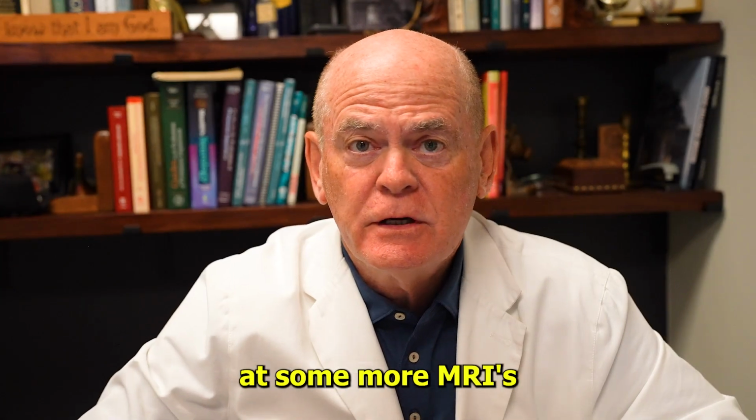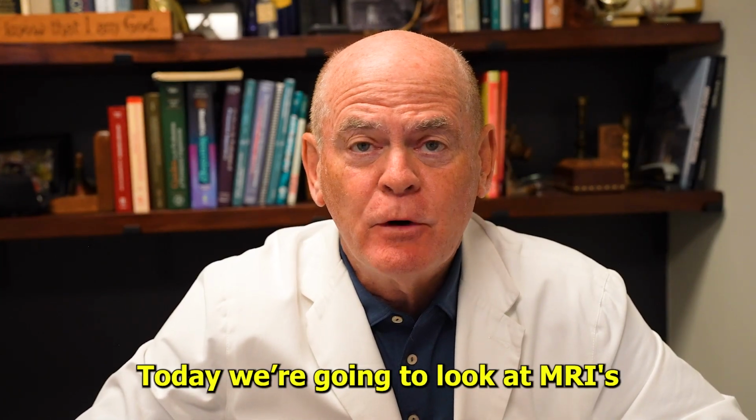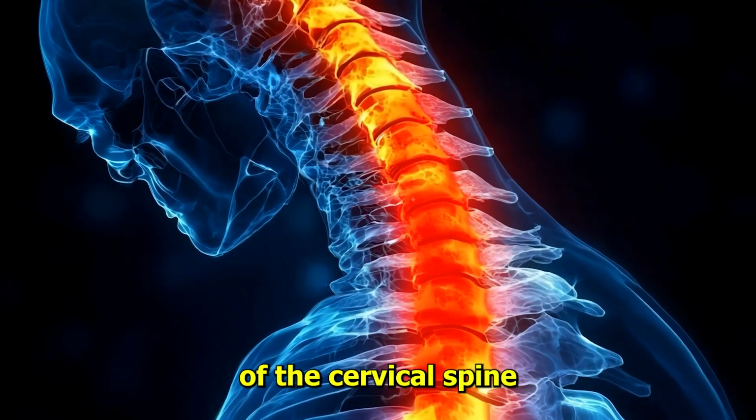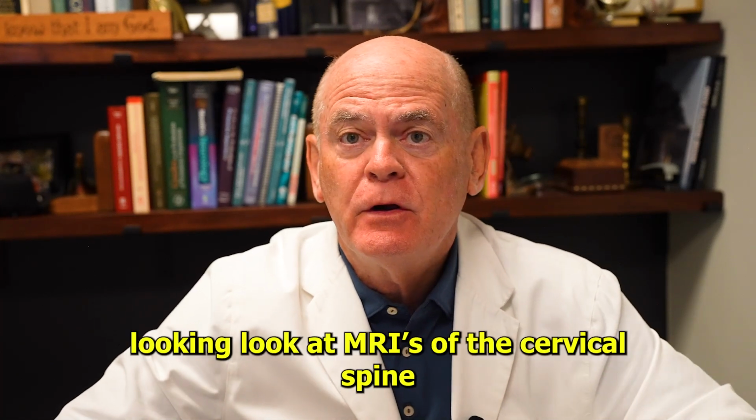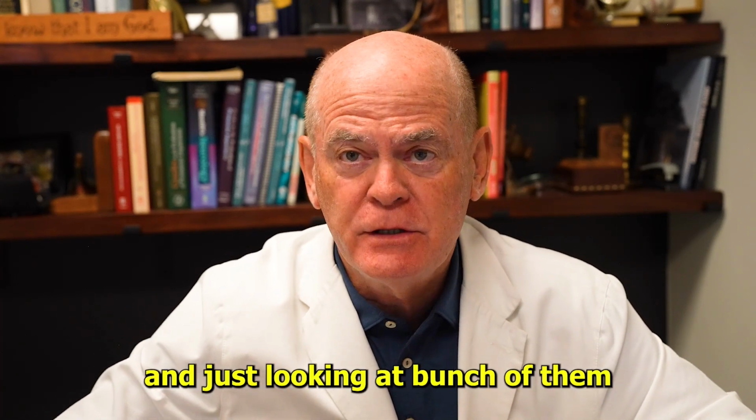Well, let's just look at some more MRIs. Today we're going to look at MRIs of the cervical spine. We've talked about disc disease and things like that. Today we're going to look at MRIs of the cervical spine, just look at a bunch of them.